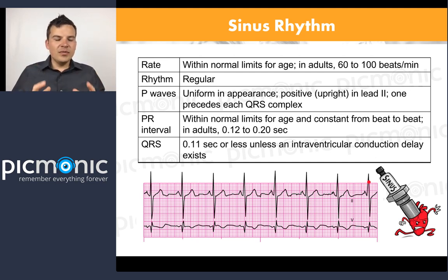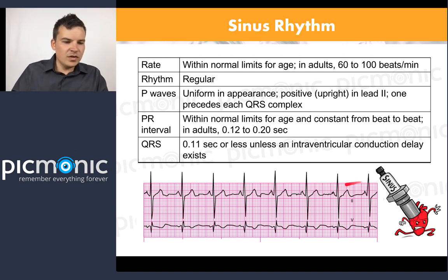For rhythm, you've got to be able to say, is this doing the same thing over and over and over again? Yes or no? Now, how do we do that? First time, I'm going to explain it to you with the perfect one, and then when we get into the harder ones, we're going to have to do some finger motion. I like to use my thumb.